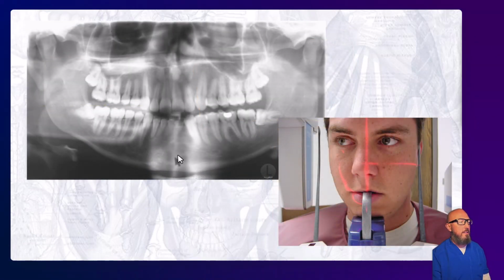In this case, what's off? This is off from the midline. So the head is rotated to the right, actually. And if you compare the size of these molars, this first molar is really wide. That one's not quite so wide. And so that's some head rotation to the patient's right side.